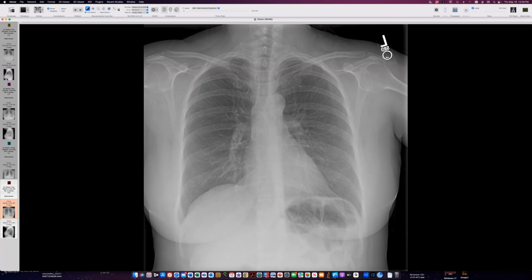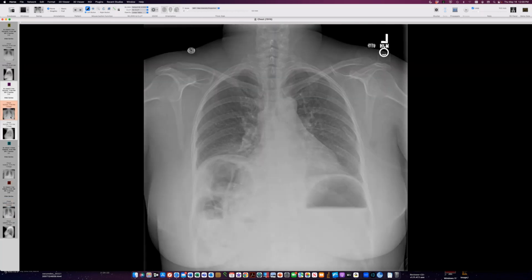So she had the operation, she had the partial hepatectomy, and then this is one of her perioperative radiographs. You can see that there seems to be a little disturbance down here. We have this gut coming up fairly high. It looks as if it's still probably contained under diaphragm here.